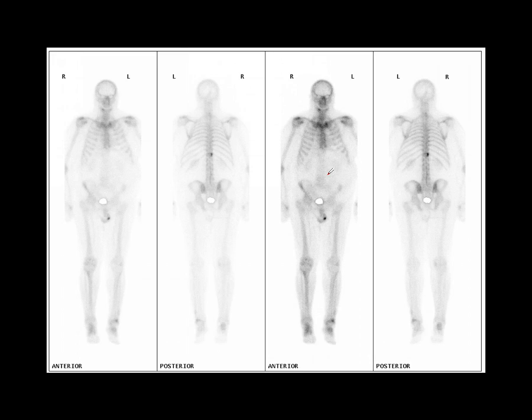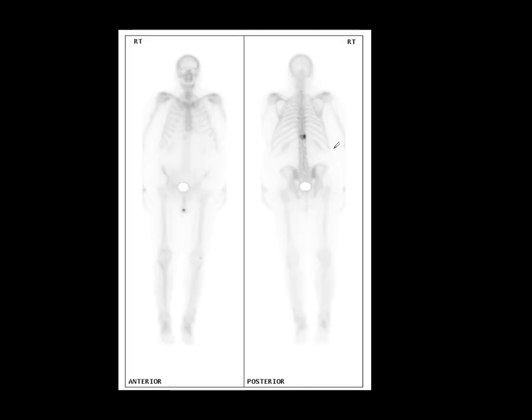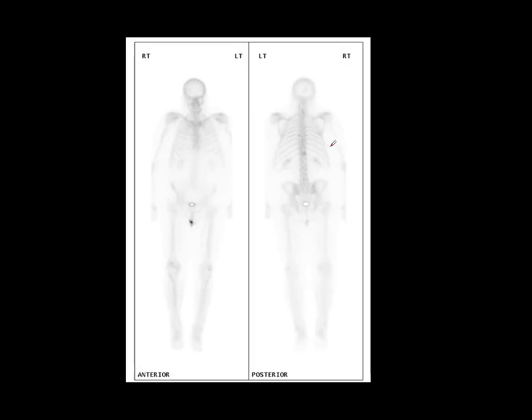You can see the patient was diagnosed with a bone metastasis, which we saw correlative CT imaging for. We gave them treatment. The PSA, I might say, actually fell during this time. The lesion became bigger, and it slowly faded away afterwards. This is called the flare phenomenon, or osteoblastic treatment response.